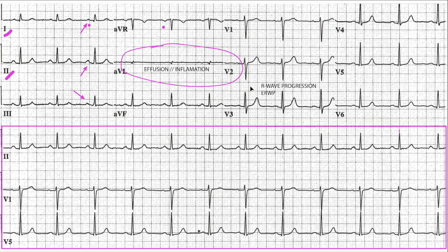So let's keep going. We've taken a look at the P wave, we've taken a look at the PR interval. The QRS is not wide. The ST segment, I'm not seeing any ST elevation, I'm not seeing any ST depression. The T wave is looking as it should, right? A T wave should have a slow upstroke, peak, and then a very sharp downstroke, coming back to the baseline. So this is looking like textbook T waves.